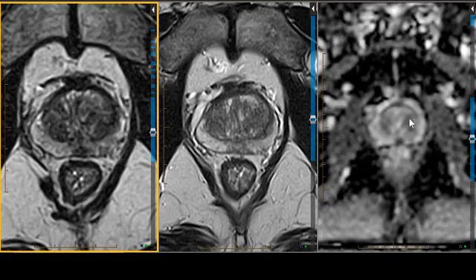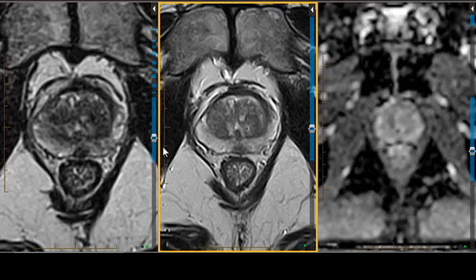And at surgery, we have the patient's report. We actually have the biopsy report, but not the surgical report. 7 of 17 cores positive, Gleason 7, 8, and 9, all of them. The left gland was affected in all 3 of those areas. The lower lying nodule near the apex, the more ill-defined mass effect in the middle and base of the gland, and this lesion in the midline entering the capsule was a Gleason 9.